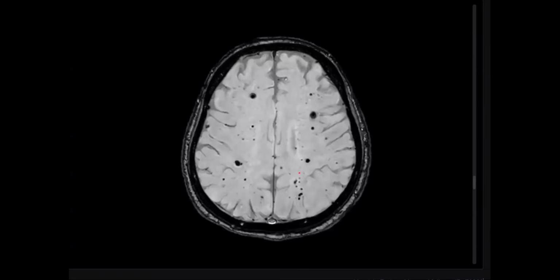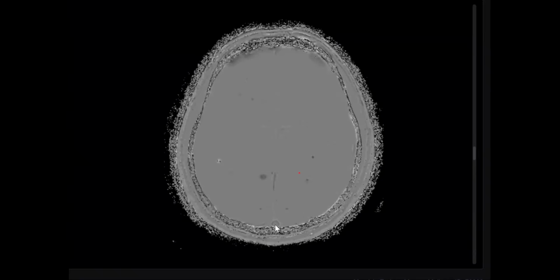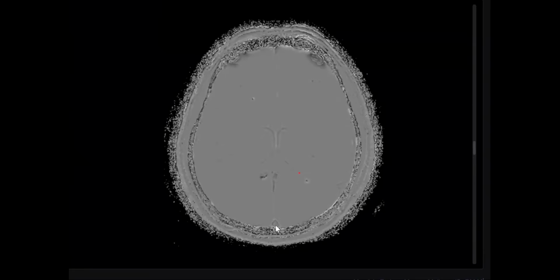Okay, about this question: if you want to differentiate between blood and calcium, we can use a phase contrast study and follow the signal of the blood vessel. If the blood vessel is dark, I'm expecting all blooming structures to be hemorrhagic. If the blood is bright, the same. All blooming will be calcium, the reverse of blood. So it can be bright or dark according to the machine.